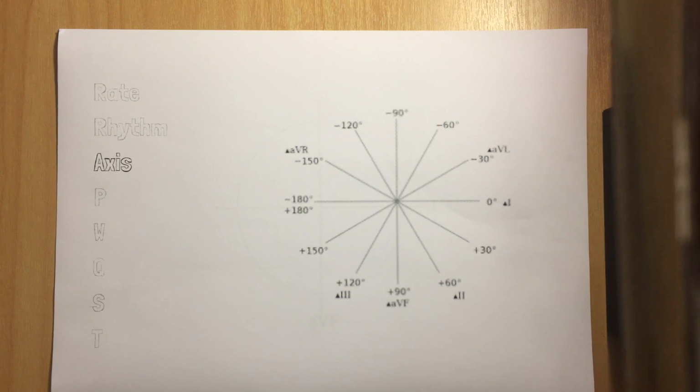So what is the cardiac axis? Well, what we're talking about with axis is that when we've got the heart in that frontal or coronal or vertical plane, which is how the limb leads and the augmented limb leads, so 1, 2, 3 are the limb leads, and AVL, AVR and AVF, the augmented limb leads. When we've got that plane and that kind of circle there, we can figure out what is the average depolarization direction in the heart, and so that's referred to as the cardiac axis.